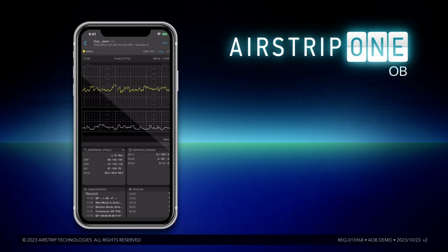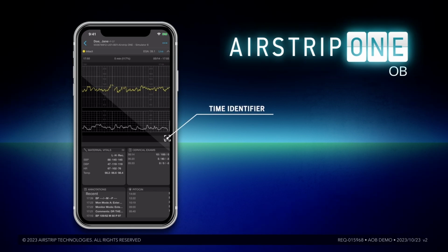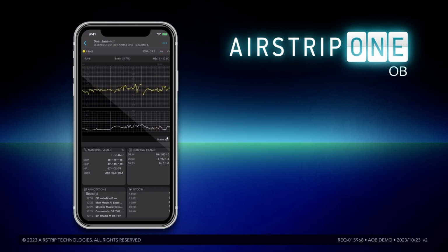Below the strip, there is a time indicator label. This will tell you the time of the strip you are viewing. The time shown is the rightmost edge of the strip that is in view. This is also the most recent time of the strip that is on the screen. Again, clicking the Live button puts the strip back to the current time.